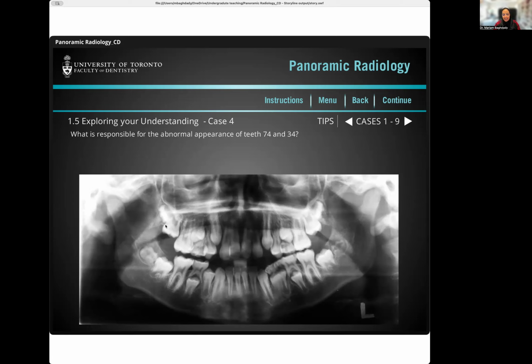So let's try to remember when we did caries before. So this is quadrant 1, quadrant 2, quadrant 3, quadrant 4, correct? But this patient obviously is in the mixed dentition, correct? So they also have quadrant 5, 6. Actually, let me do that for you guys. I'm finally going to use the annotation. Woo.